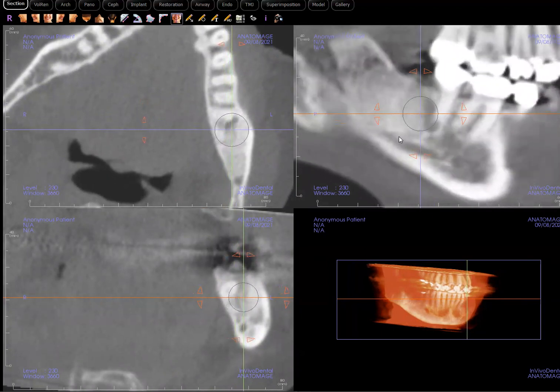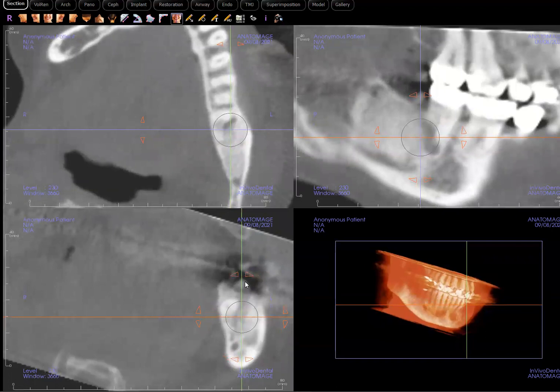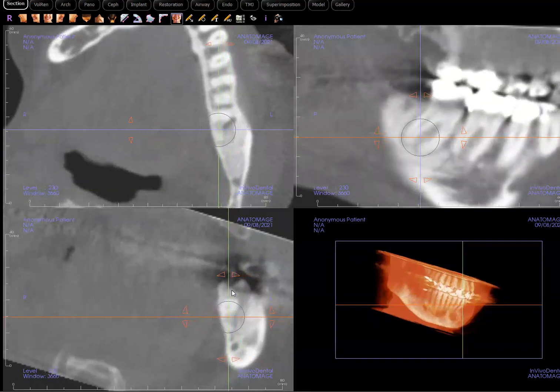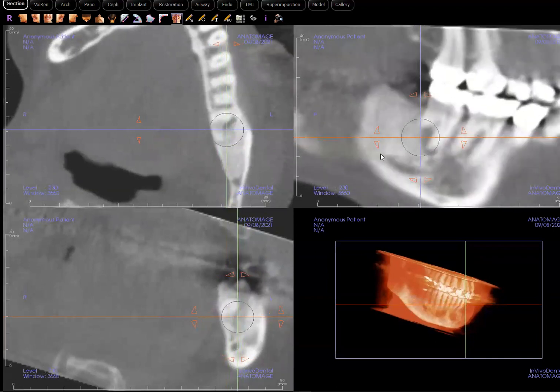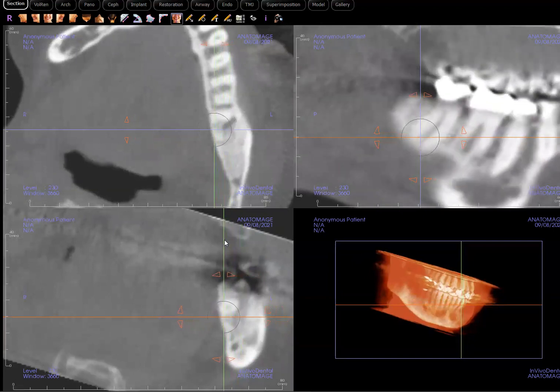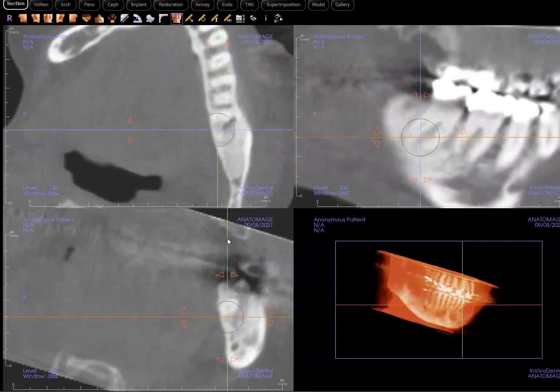I just, as I was looking at it, I was seeing kind of a bifurcated mandibular canal right here. And was trying to follow where that nerve goes to. It's arising somewhere here and it courses anteriorly like that. Oh, look at that. Oh, look at that. I think it inserts right into the distal root of number 19. Maybe the other branch goes to, oh, hard to tell. The other branch may be going to number 20.